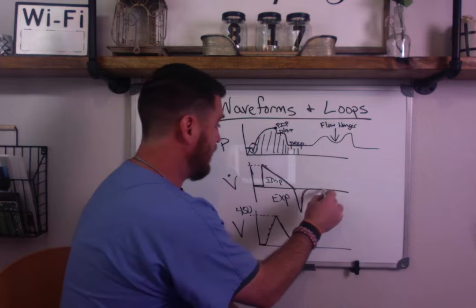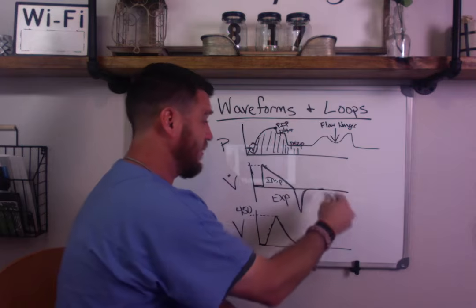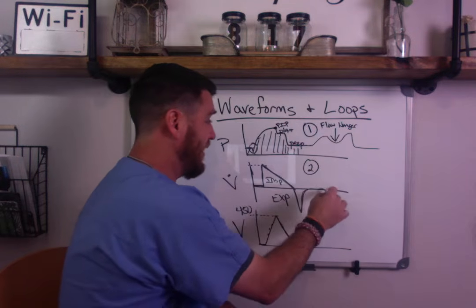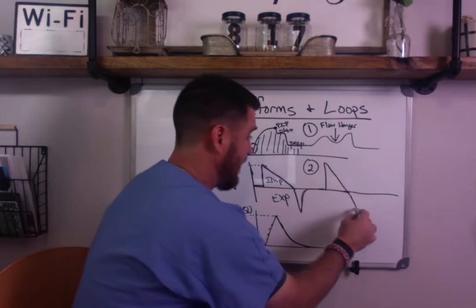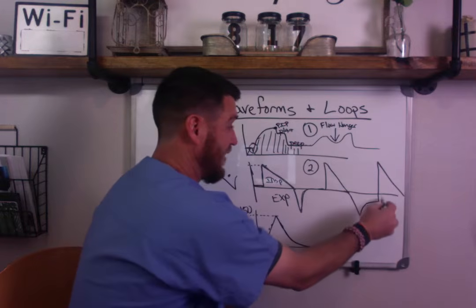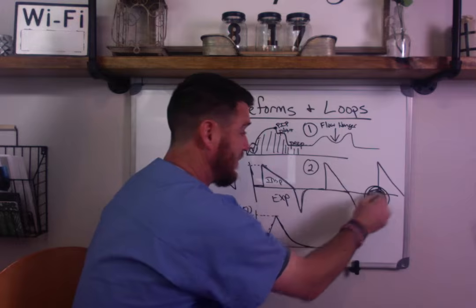Now, when we go down here to flow, separate from the flow hunger issue, this is another one. When you're looking at flow, so this is example 1. Now, example 2 is if you ever see this. Your flow comes like this and like this. Now, the problem here is this gap between baseline.